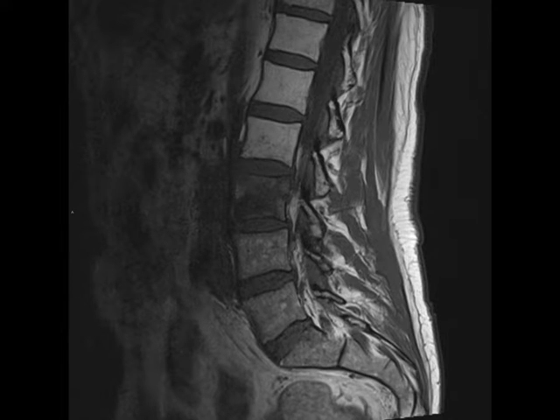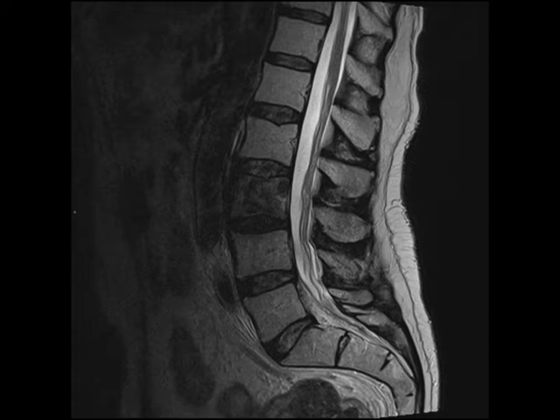This is a middle-aged male with a history of pancreatic adenocarcinoma, status post-Whipple, followed by radiation therapy. The patient presented to his doctor's office with worsening lower back pain, for which an MRI was obtained. The images demonstrate an infiltrative T1 hypointense, T2 heterogeneously hypointense, heterogeneously hyperintense mass involving the L3 vertebral body.